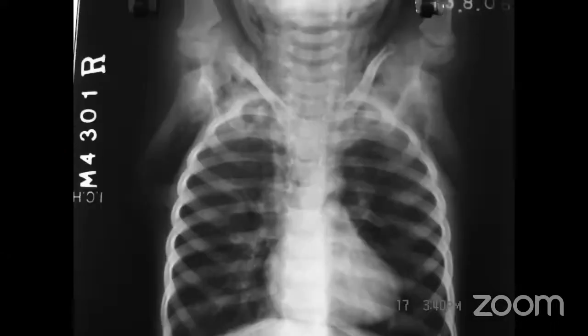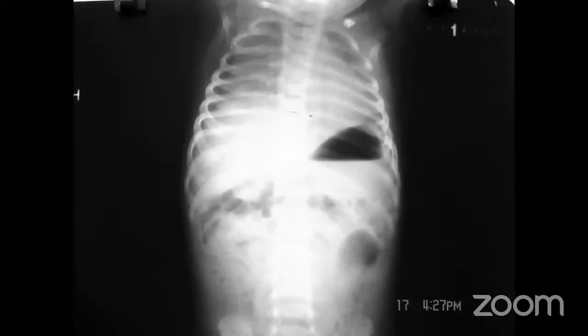So, what is this? Again, you just write down the answer within 10 seconds. So I got two answers. What are the answers? Empyema, hyaline membrane disease. Hyaline membrane disease. Right pneumothorax. Someone has said right pneumothorax, which is a very good guess.